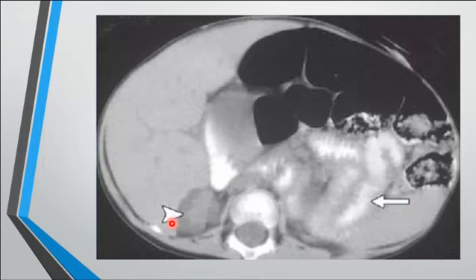What's this pointer pointing to? See, this pointer is the answer to the case. No history of trauma, but a history of chronic disease in the same patient. What is this pointer pointing to? What's here? What organ is here?